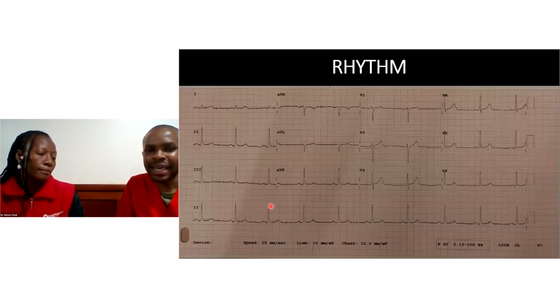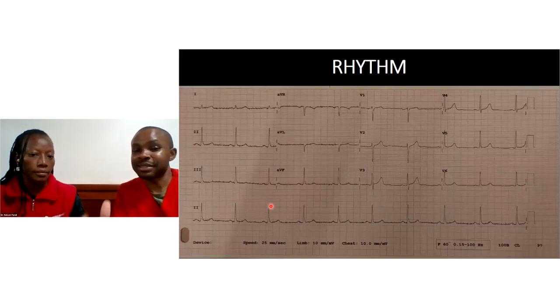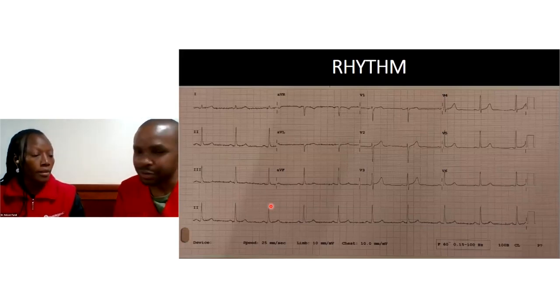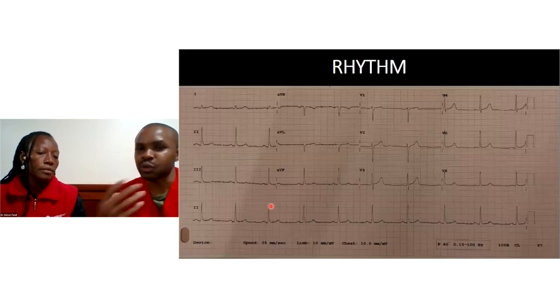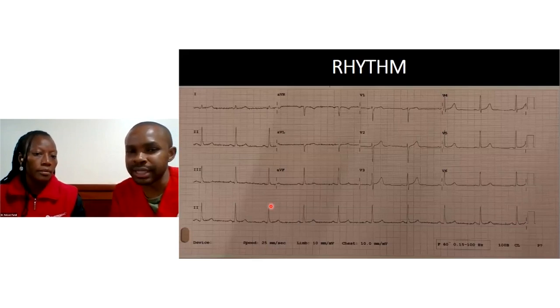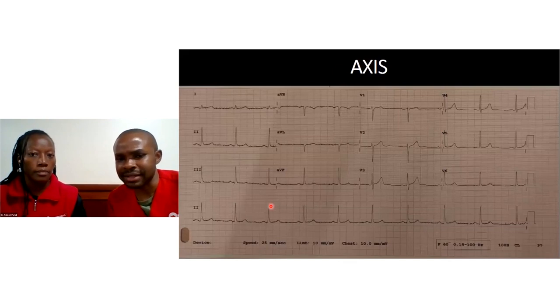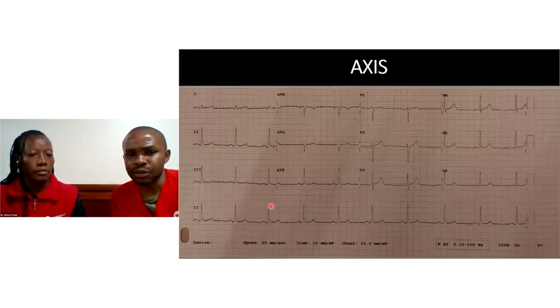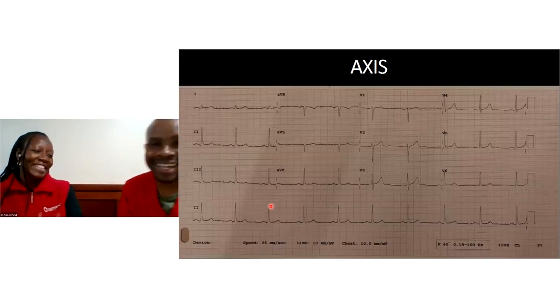Right. And for today, we are doing basic ECG, which means if it's a regular rhythm, we are happy. But as we build on this content, we'll find that with irregular rhythms, we're asking ourselves, could this be contributing towards our patient's pathology? So we've done the rate, we've done the rhythm. The next one is to have a look at the axis. Do you want to have a go at this, please? Or do you want me to? All right, so you give it.